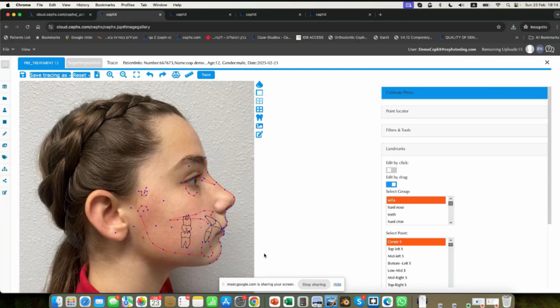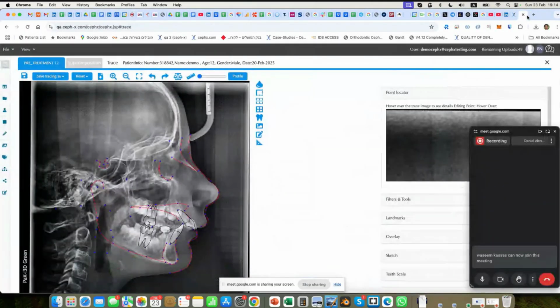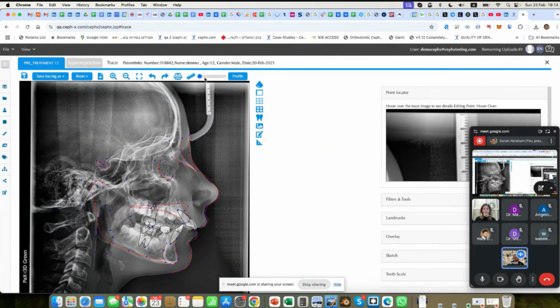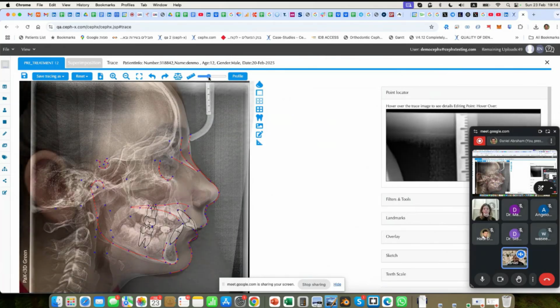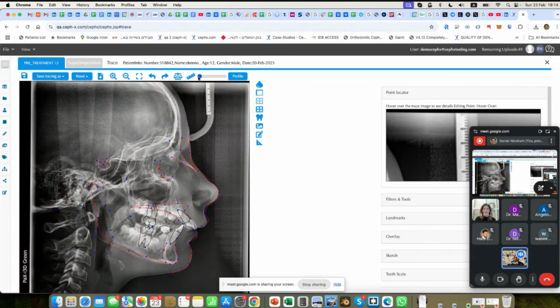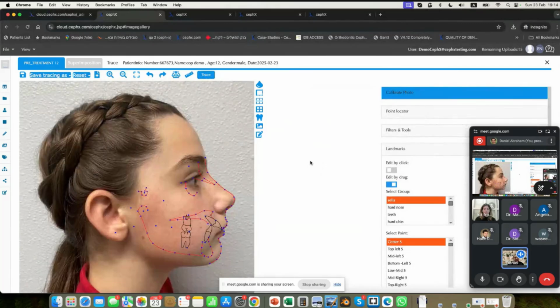I think I've got a sample of a profile. This is not released yet, but just so that you know, you'll be able to also just shift over the X-ray to the profile automatically with this slider. So again, all of it was done for you automatically, but the idea is that you've got a wide variety of options, and pretty much everything is being done automatically for you.